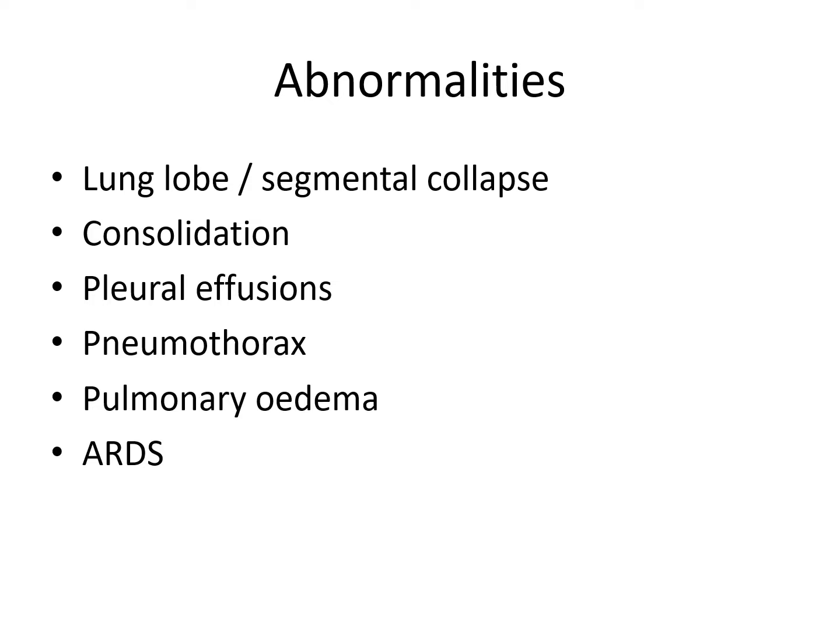Crowding of the ribs is due to decreased movement of the underlying lung tissues. Lines of atelectasis might be able to be seen, classically along the fissures. An X-ray during exhalation could show air trapping or atelectasis, as all the other air is out of the lung and that air is becoming trapped.